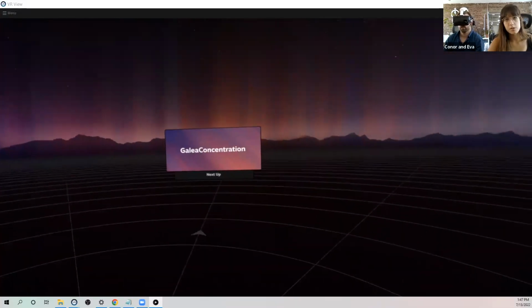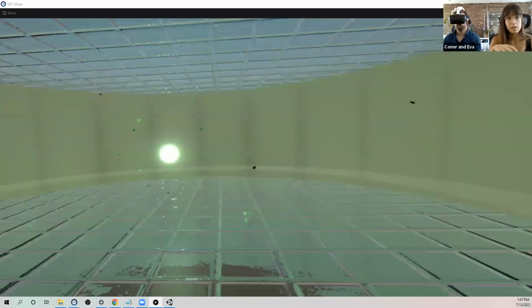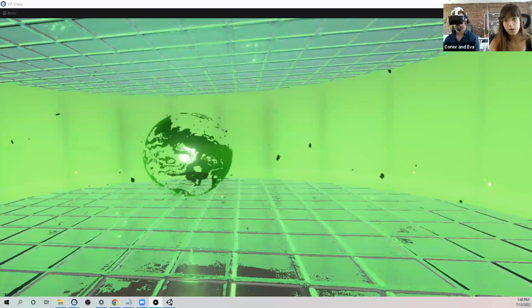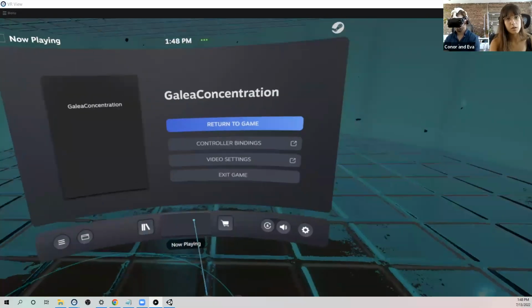So synesthesia room is just loading, and it's a room where you see this glowing sphere that will change color depending on the brain frequencies. We actually mapped the colors of the sphere to the band power widget. If you can open the GUI.